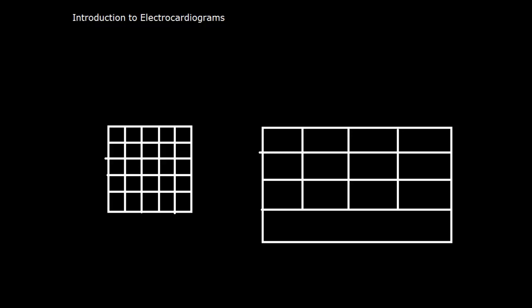All right, so getting started. Let me fix my colors here. Okay, so most of you should know that ECGs are often printed on graph paper.